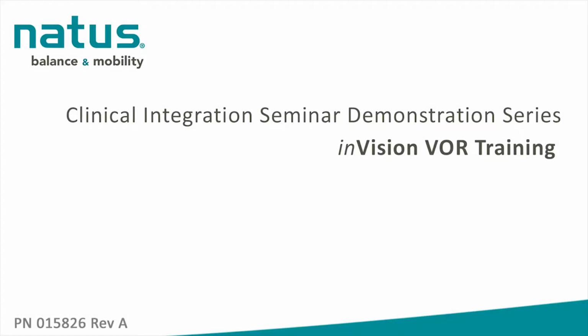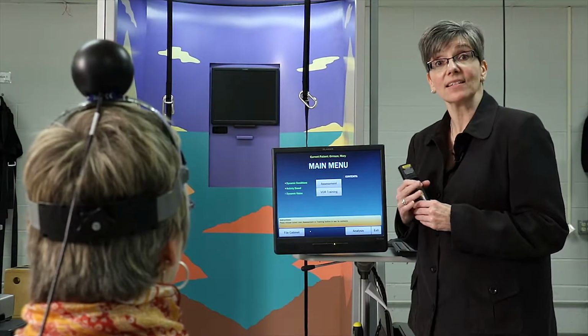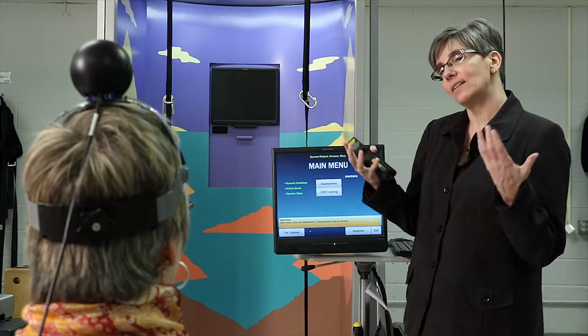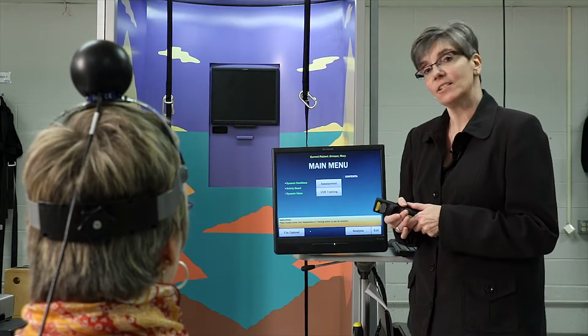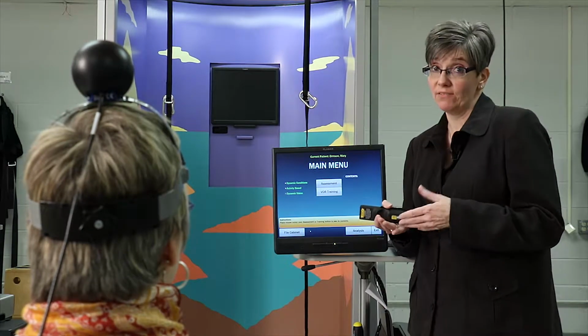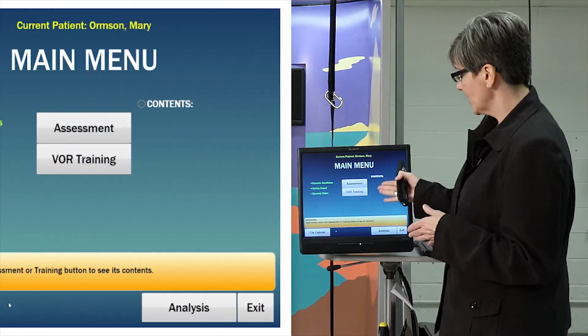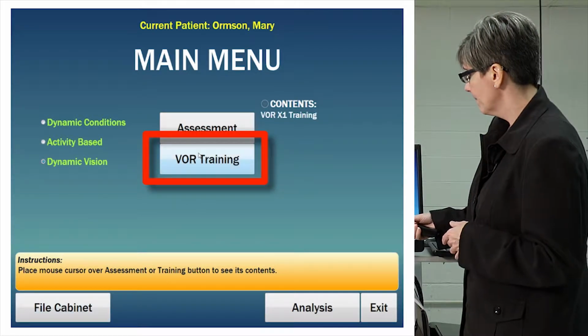This next section is VOR Training. This is an application that as clinicians we're very excited about because this actually gives us an objective starting point for VOR training, so we can send our patients home with an exercise program that's appropriate for their level of difficulty. So I'm going to start here and click on the VOR Training icon.